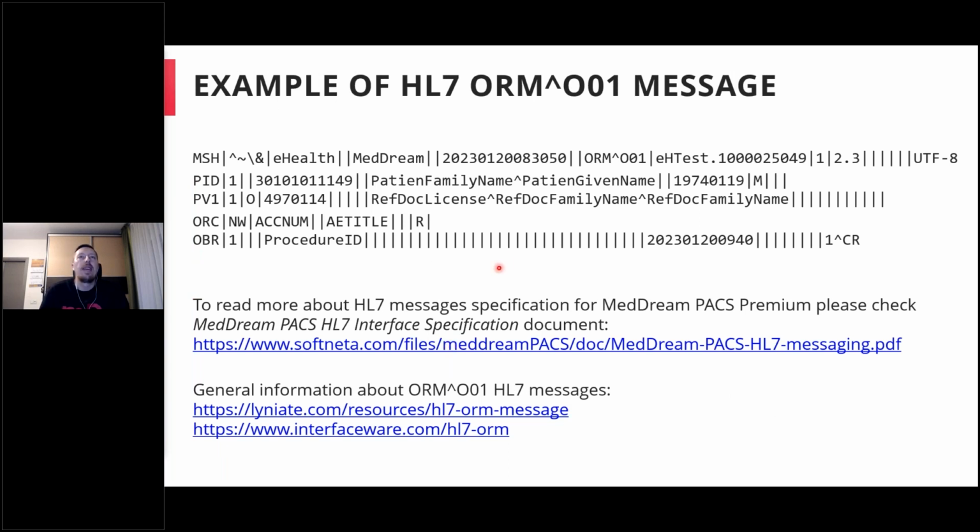Here is an example of a very simple HL7 message. As you can see, it's an ORM message. You can find this message in our MedDream PACS HL7 interface specification documents. You will find it in your MedDream PACS documents. And I just put here some links with general information about HL7 ORM messages, but of course you can find much more information online.